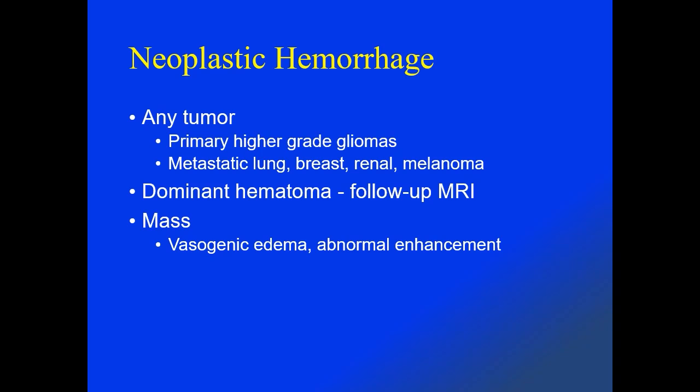When a dominant hematoma is visualized on the initial imaging of the brain, a follow-up MRI without and with contrast should be obtained to make sure that there is no underlying mass that may have been the cause for the original hematoma. This may take days to weeks for the hematoma to decrease or resolve before the follow-up MRI can be obtained to better visualize the underlying mass.